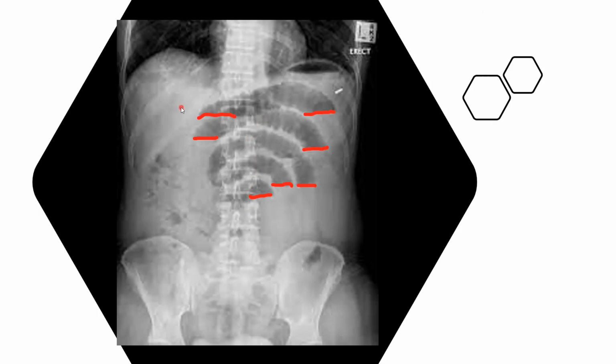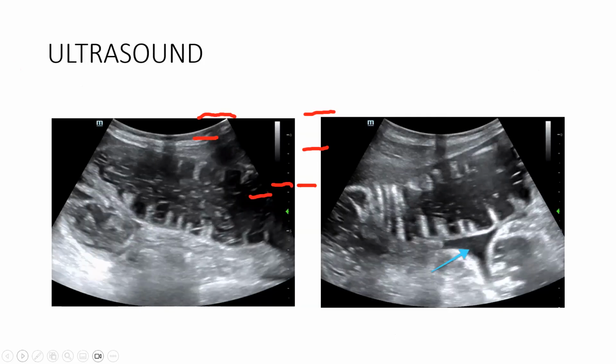And so that's basically what we look at in these X-rays. The other thing that I wanted to show you is that if you are lucky enough to have the opportunity to have an ultrasound in your department, which we used to, unfortunately we don't anymore, but when we did, we would also ultrasound these patients.